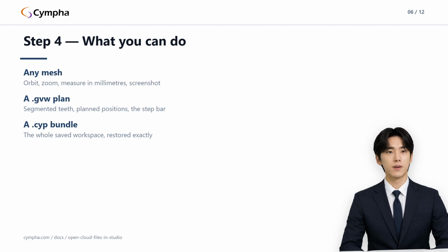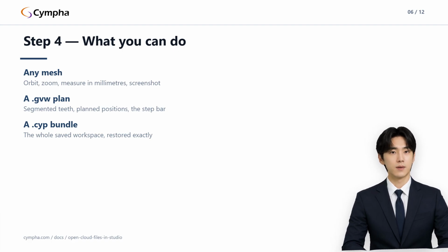Whatever you opened, the working verbs are the same. You can take screenshots and save them locally, often that's the whole errand: capture a view, drop it into a message. You can measure point-to-point distances in millimeters, which answers most quick clinical questions about a scan.